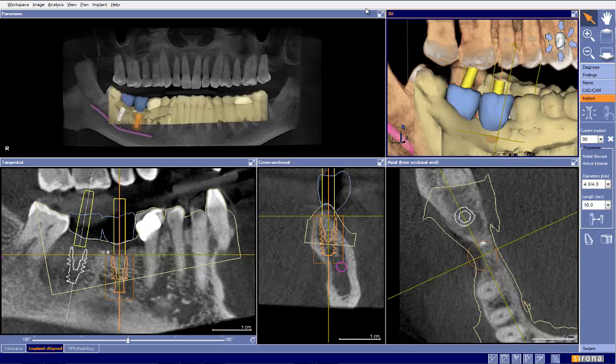31 looks like it has enough bone. 30 looks like it would need some help. I had trouble finding the nerve canal below 30 and 31. Is number 30 a graft first and place implant, or place and graft at the same time? Also, how do I handle the lack of attached gingiva in site number 30?